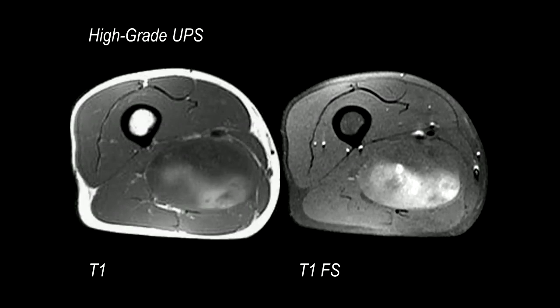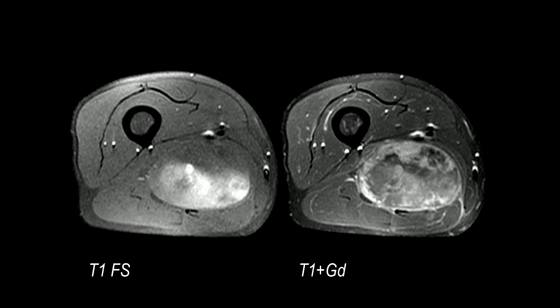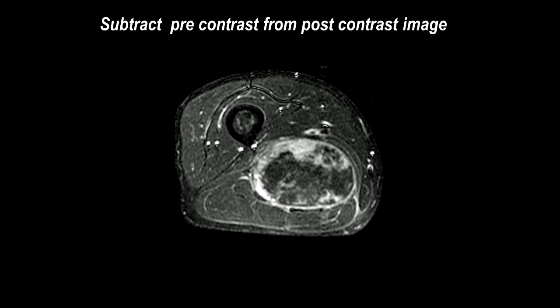I also like for tumor patients to have fat-suppressed T1 weighted images. Now, we can generally see subacute blood fairly nicely on T1 weighted images, but certainly we see it to better advantage on fat-suppressed T1 weighted images, as demonstrated in this case. And the other thing I like about the fat-suppressed T1 weighted images, that if you do give contrast, you can actually subtract the pre-gadolinium fat-suppressed T1 from the post-contrast image, and in getting the full idea of exactly what is truly enhancing. And certainly if you're planning a biopsy, this allows you to target your biopsy to the enhancing viable portions of the tumor rather than the necrotic areas, which really becomes very important in getting appropriate tissue for diagnosis.